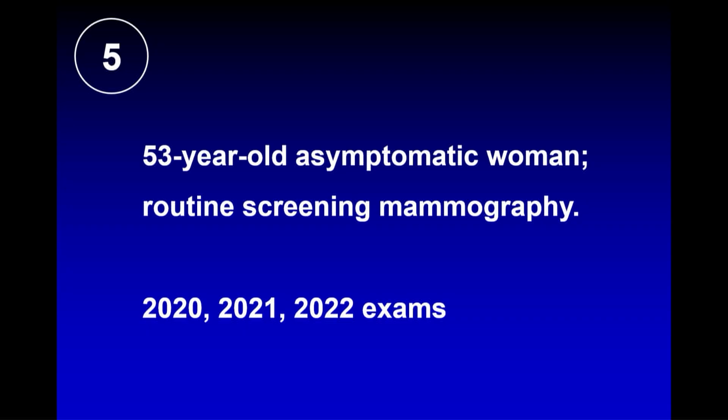Although that isn't completely true, because I'm going to show you a few of our failures too. And you may wind up having found something that we didn't find until the next exam. So I don't want people going home and saying, oh my goodness, there were 20 cases and of those there were a certain number of cancers and I only got half of them. Well, that doesn't mean anything. I'm just showing you our successes. That doesn't mean we all would have gotten them either.